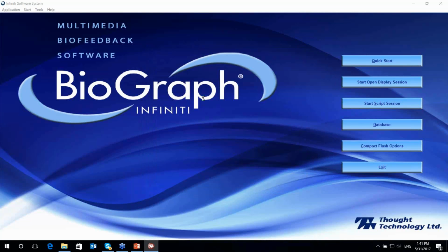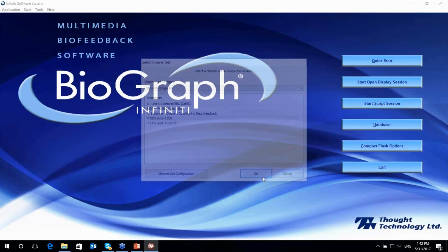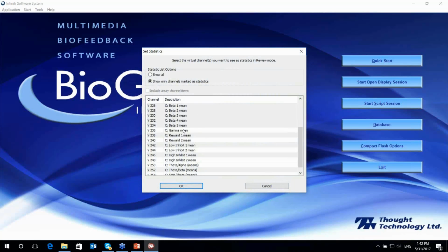I'm going to click OK. It's asking for a channel set for review. We're going to keep this. Don't change this. Always keep that same one. Now it's asking for the exact same statistics to show in review mode, and that's fine.